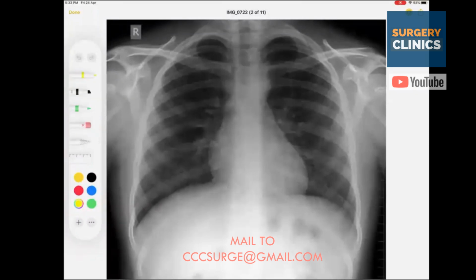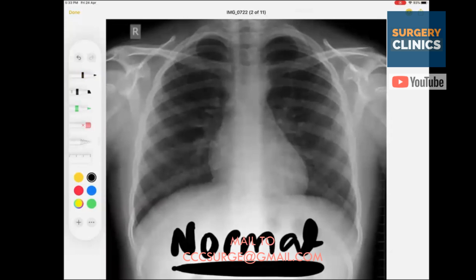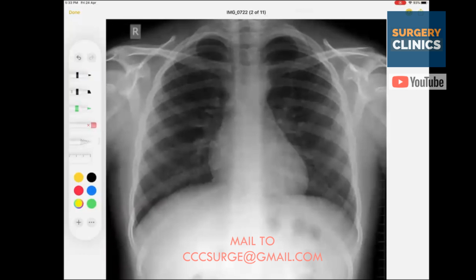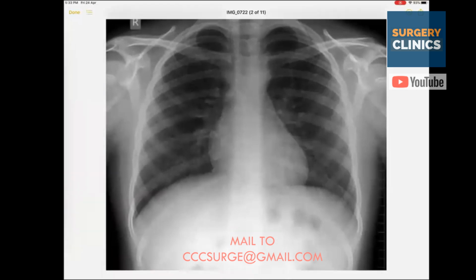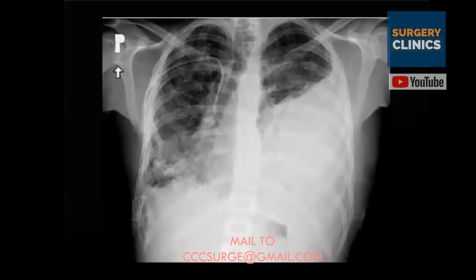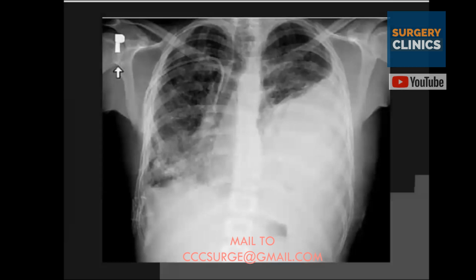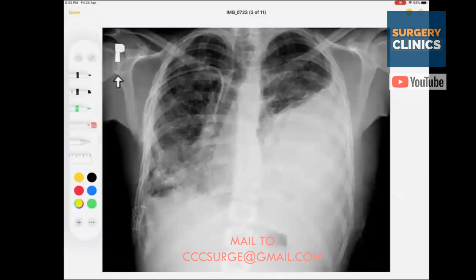So, give me a minute, please. Yes. So, this, guys, is normal. I could not see, and I've taught you this one. Now, if this is normal, then tell me, okay, if this is a normal X-ray, then tell me what is bad in this one. In this picture, tell me what is wrong, which component has something that is bad.